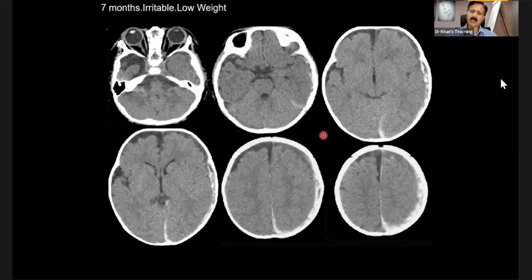Excellent. So I'm not showing you NAI for the simple reason we have covered it in the PED section, but one case I just wanted to show you what is happening is acute over chronic subdural, which goes all the way here. And another finding is that if you see here, there is atrophy of this temporal lobe. This is not an arachnoid cyst. You can see it is atrophic. And with this kind of unifying diagnosis, there might have been a previous contusion, and now there is a bit of focal atrophy. So this is NAI.